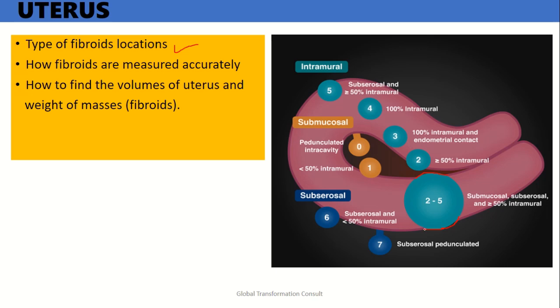So impinging on the corpus of the uterus down, and at the same time it's in the wall of the uterus, that's the posterior myometrium, which is intramural location. And you also have subserosa. Subserosa here looks the same as this, also pushing the whole wall of the uterus down like that.